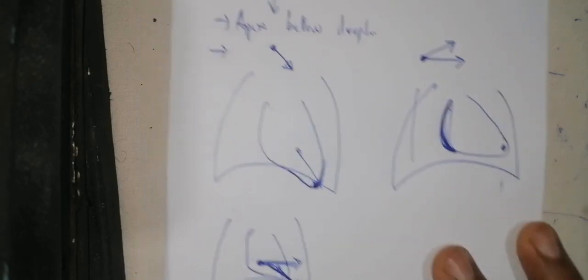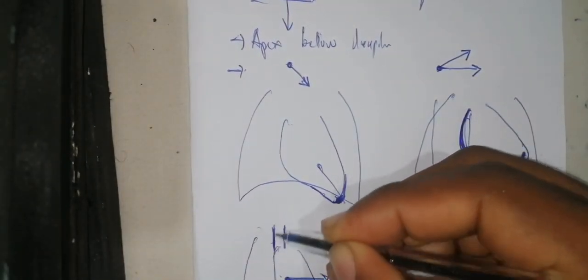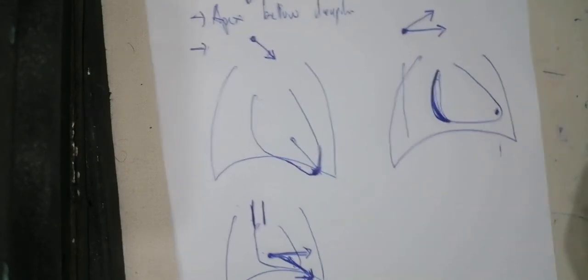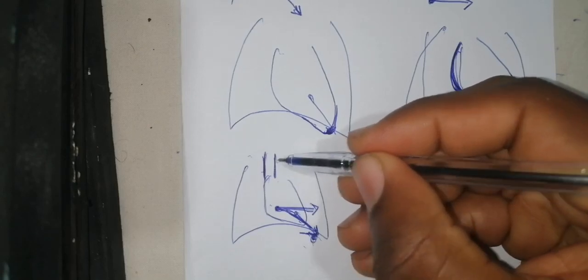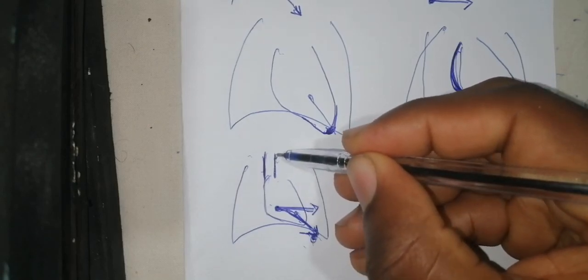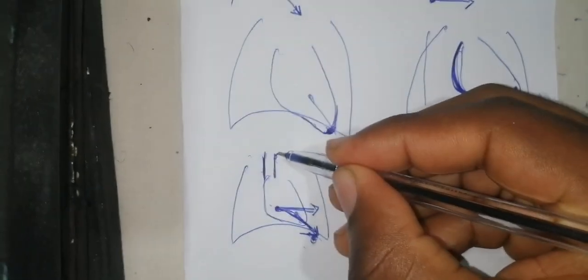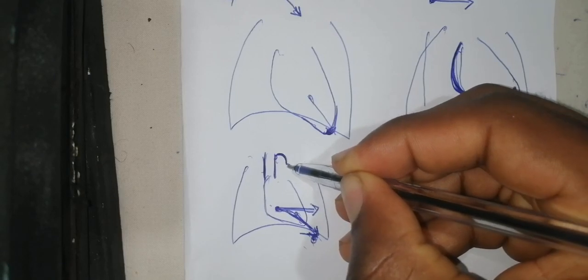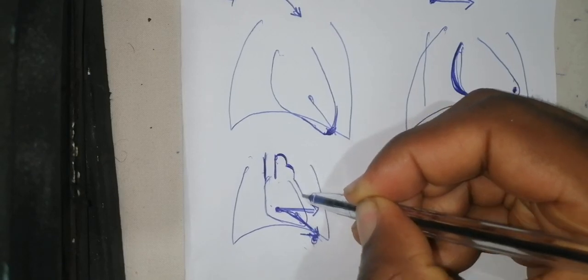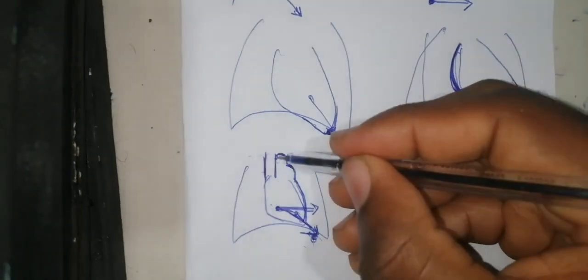Another element that you can see on X-ray, you have the superior vena cava. The superior vena cava is what enters directly up here, as I've explained. Now, the pulmonary trunk, to visualize the aortic arc, you need to know that the cardiac silhouette has 3 arcs on the left side. You have 1 arc which shows the aortic arc, you have 2 arcs which shows the pulmonary trunk, and you have the third arc which shows the left ventricle. Those are the 3 arcs.